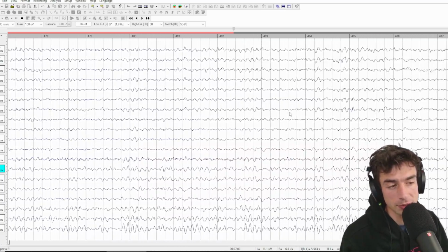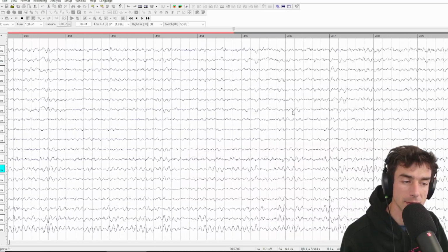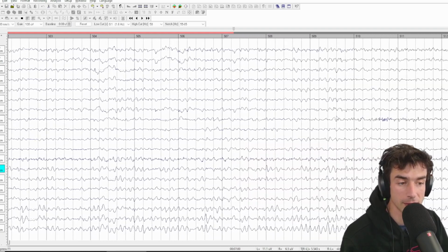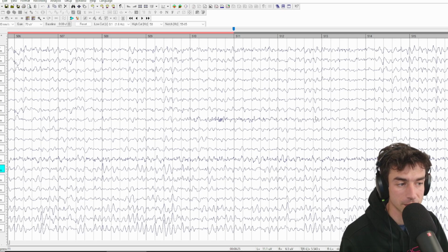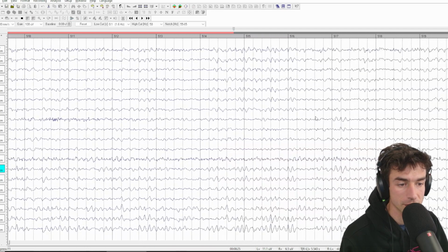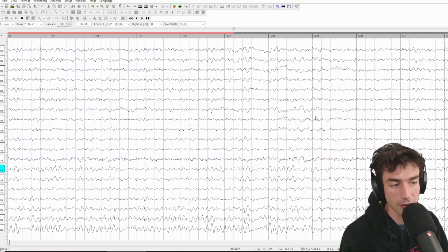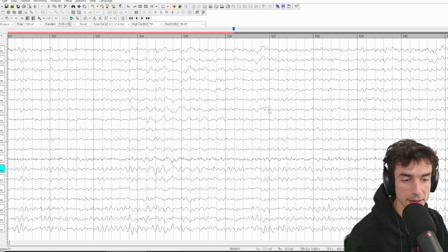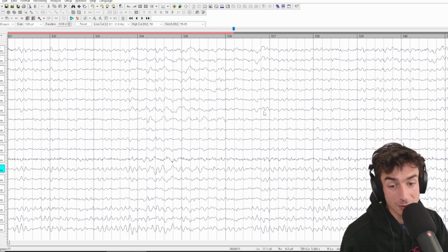Interestingly, we saw more bursts of frontal theta when the eyes were open, right? And frontal midline theta is a normal functional process. It can be a projection of the limbic system, right? A way for the anterior cingulate to couple with the frontal cortex, ideally cross frequency coupling with beta when there's a functional cognitive action to take place.